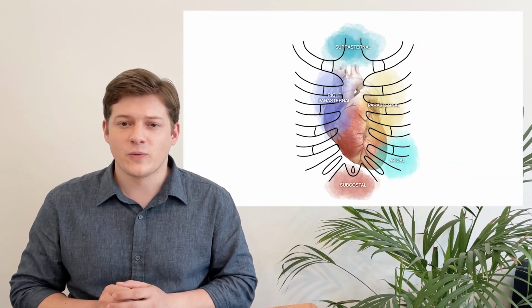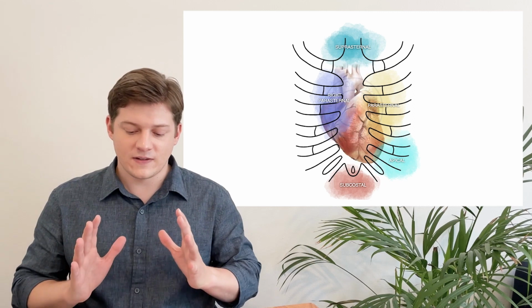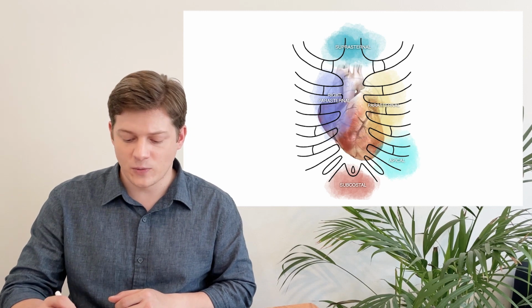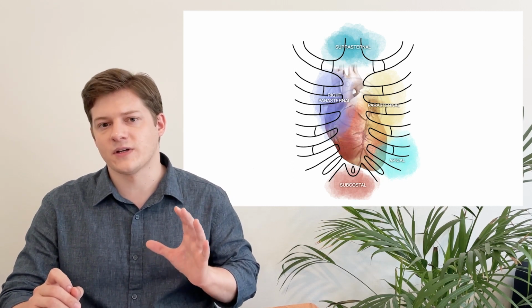Well, first of all, we need to understand all the different cut planes we have and where to actually start. The cut planes are shown quite nicely here in this graphic. In this graphic, you can see that there is a parasternal window, an apical window, a subcostal window. Those are the windows you will mostly need in your echocardiographic exam.